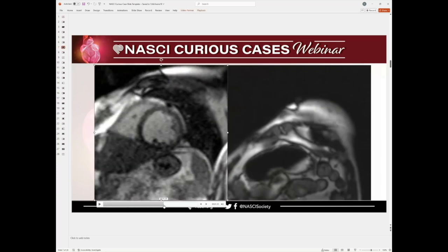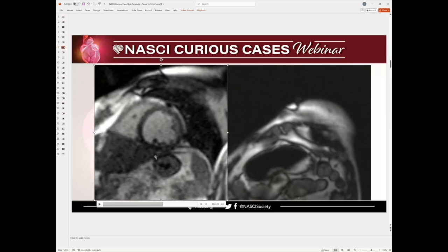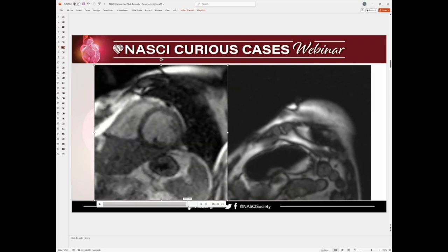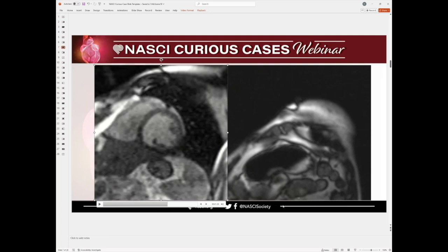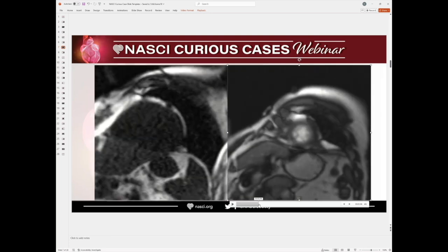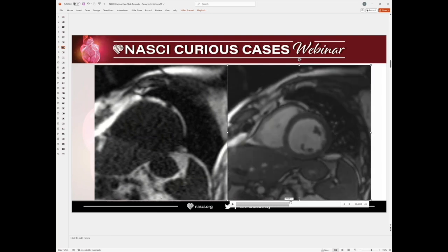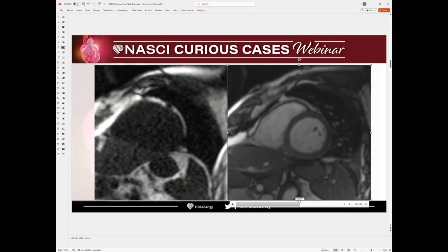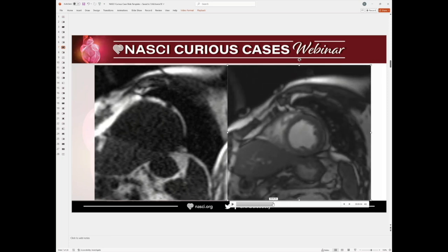Okay. So in this case, we are looking at the perfusion. I know the contrast is not great, but as you can see, this is the perfusion image. This is not stress perfusion, this is rest perfusion, but you can see at least in the RCA territory there's almost no filling. Even if you go further, this area is completely infarcted. And this is the functional imaging showing the area. You can see that there are lots of things going on in this image. It's not just the hypokinesia of the inferior wall, but also the intraventricular dyssynchrony.